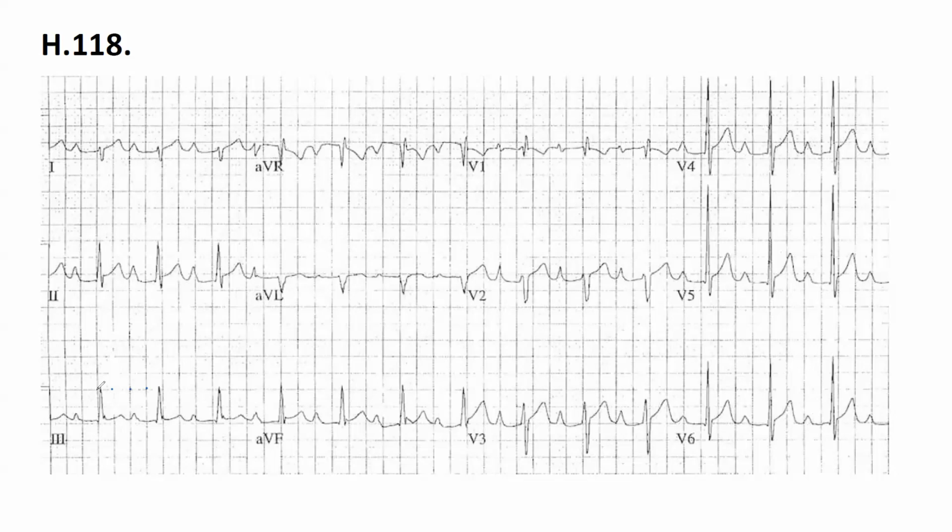I would say this is 3.5, so it's less than 4, so you can go for 80. Because if you look here, for example, this matches this line. 1, 2, 3, almost 4. A little bit less than 4. It means faster than 75. So it's 80.